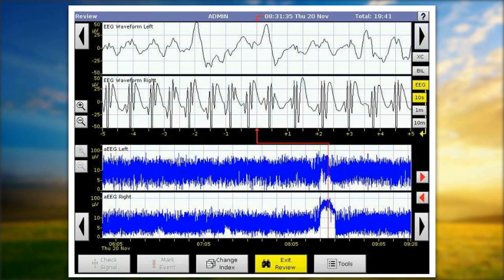You can see you're going along and you have this discontinuous tracing, and all of a sudden on the right side, there is this massive change. The change again lasts for 10 minutes. It increases that bottom margin, it turns into an archway, and then it comes down and it goes away. So that's that crescendo, decrescendo. The amplitude of that seizure started out a little bit smaller, got bigger, bigger, bigger. Here we're at the maximum part of that, and then you would begin to see that the seizure goes smaller, smaller, smaller, and goes away. So here we have this discontinuous pattern with this massive seizure right in the middle.